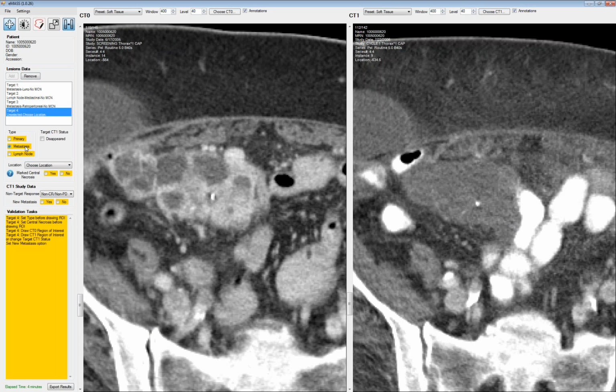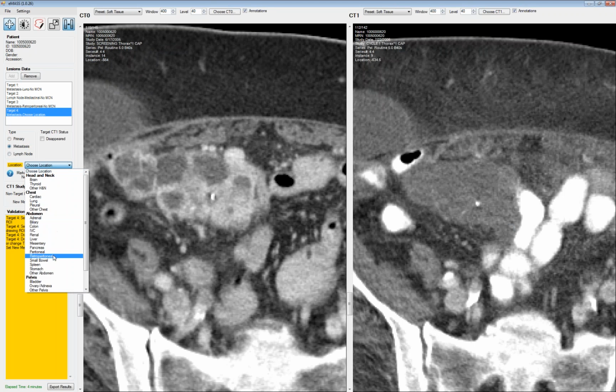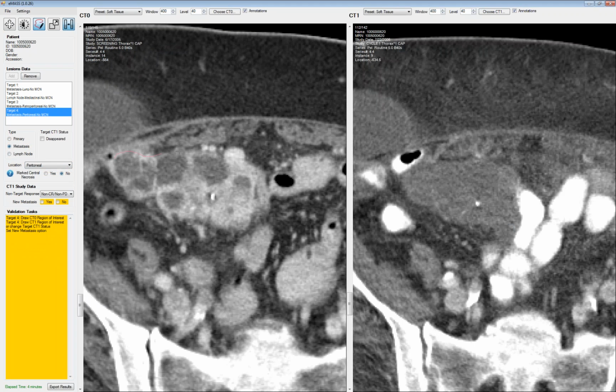I can tell you that it's very tempting not to zoom when you're doing a real case because you want to move quickly as a radiologist, but this software just makes it so easy because once you do the zooming and get accurate measurements, it's going to snap back to place for you. That's part of the reason we don't like to zoom, because you have to zoom in and then zoom back out on normal PACS workstations. So this handles that very nicely.